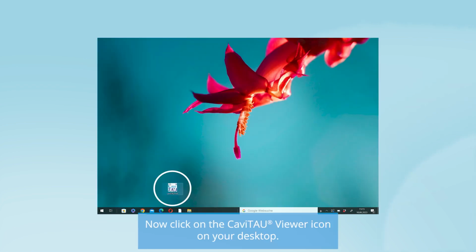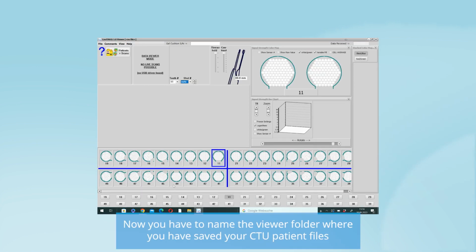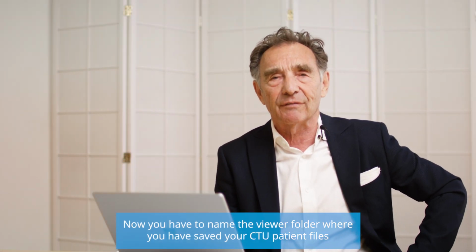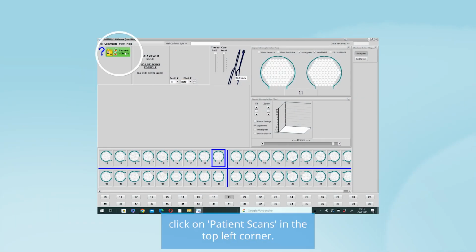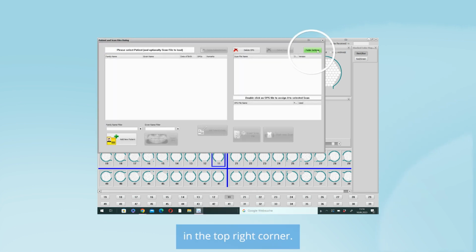Now, click on the CaviTAU viewer icon on your desktop. Wait until the viewer starts. Now you have to name the viewer folder where you have saved your CTU patient files so that it can find them. To do this, click on Patient Scans in the top left corner. A new window will open with folder settings in the top right corner.